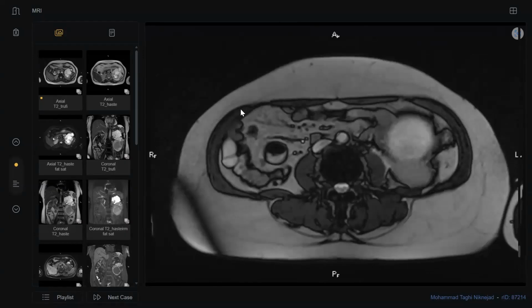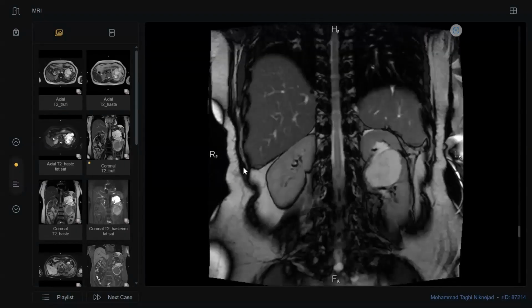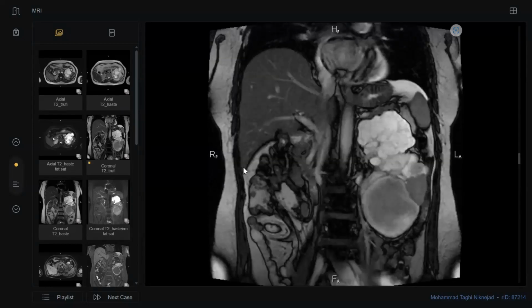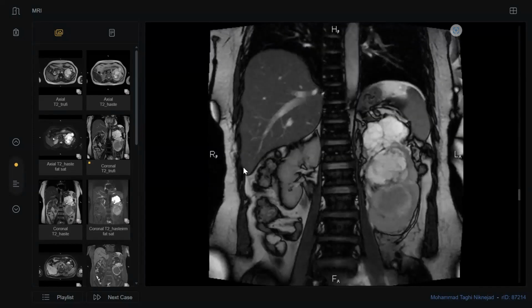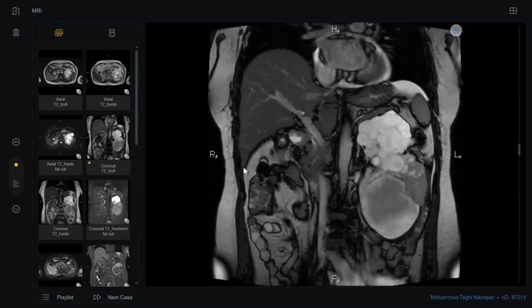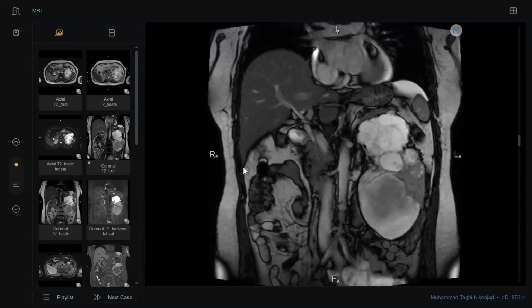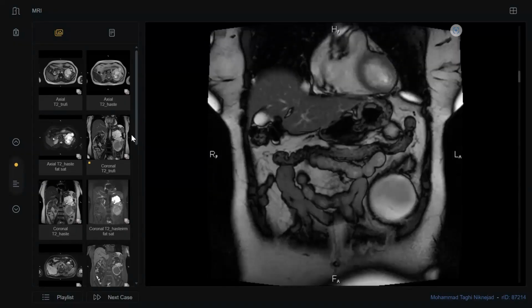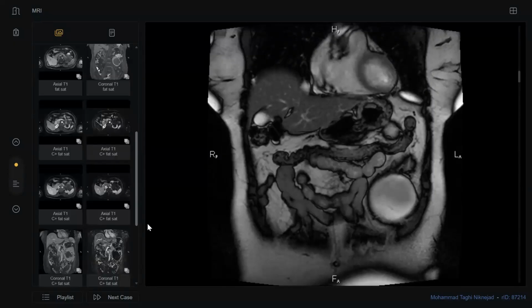Can I check the kidney again, please? The left kidney. Yes. Okay. So this is a T2 coronal image. There's a large lesion showing multiloculation and diffusely hyperintense signal. I'm trying to check the rest of the kidney itself. Its epicenter appears to be from the renal pelvis.